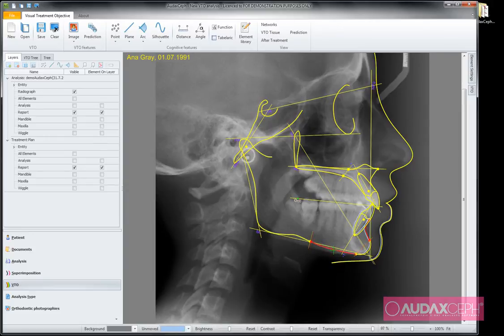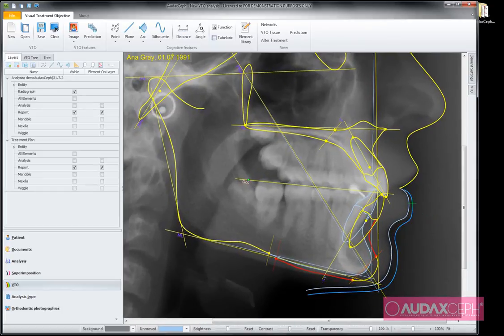I just grab it and I select a new position, for example something like this, and perhaps I'm going to move these teeth into that direction, or to rotate it a little bit and place it back, and so on. And you can see how geometry changes because of different techniques during the operation or during the surgery.